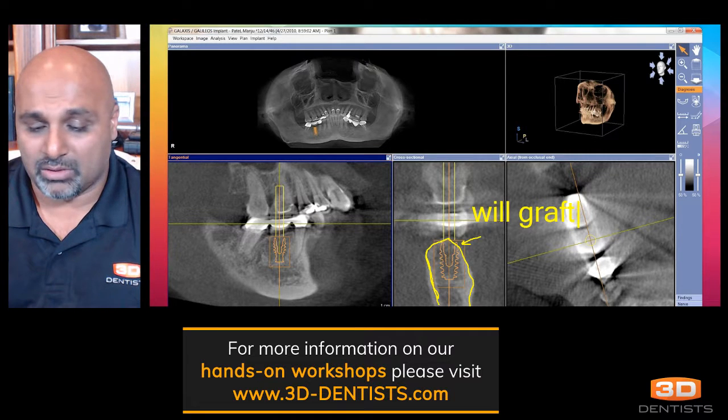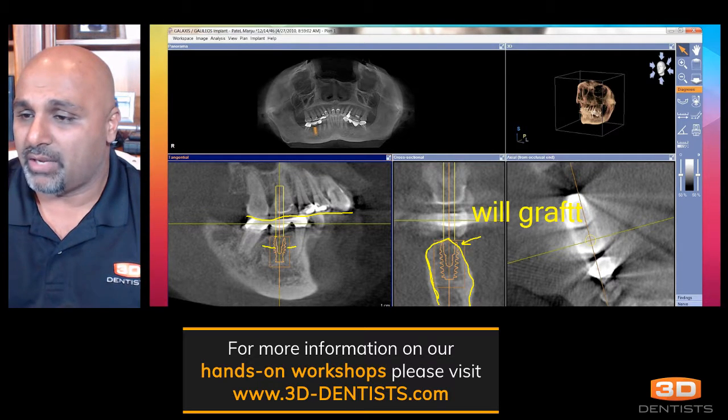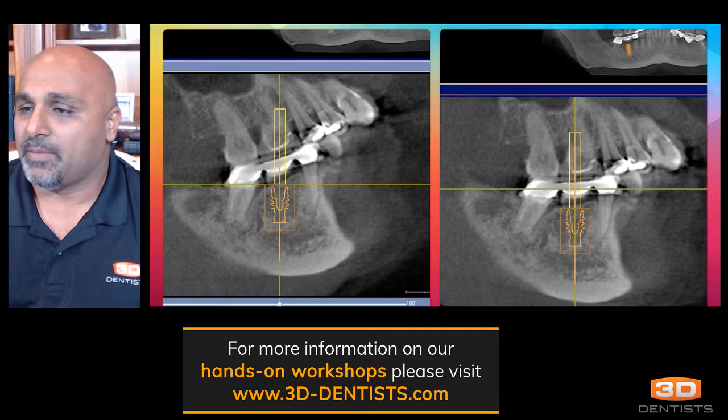But what we also need to look at is that our occlusal plane is correct. We're still centered between the roots. And more importantly, when we look at this, we can see that we're going to be able to create an emergence profile that's going to minimize food trapping between the implant and the natural teeth. So we want to make sure that we have these things.